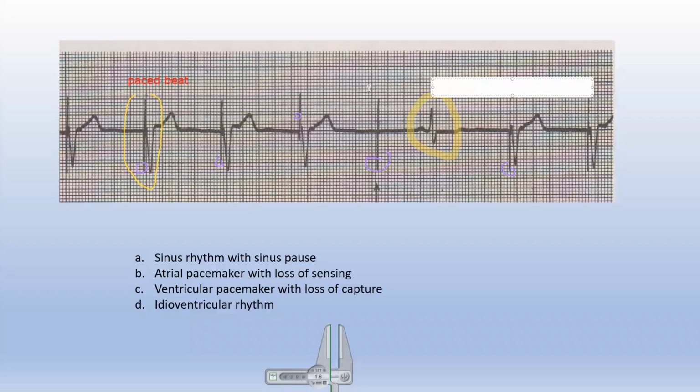And that significant finding is the presence of a spike right over here. There's a spike right over here that is not accompanied by anything at all.